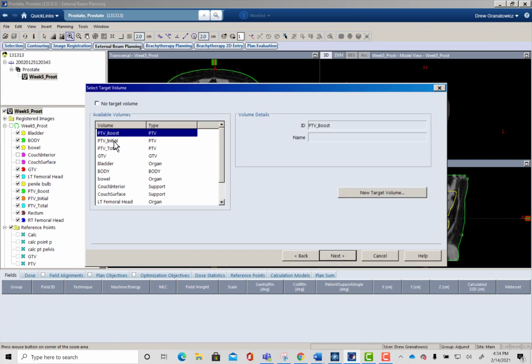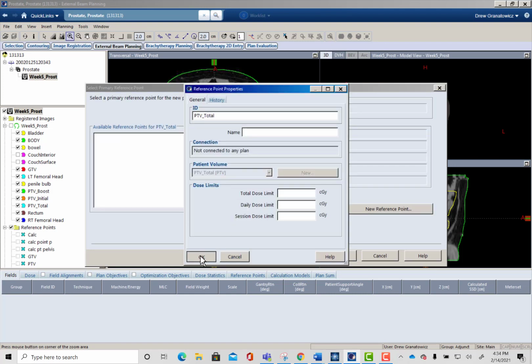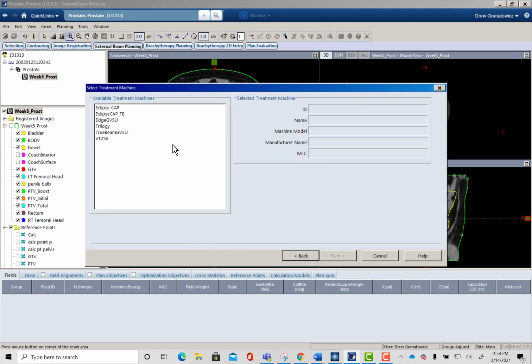For this week, I want everyone to pick PTV initial. We're going to be, or no, PTV total. Sorry, I'll show you the difference here in a little bit. PTV total.